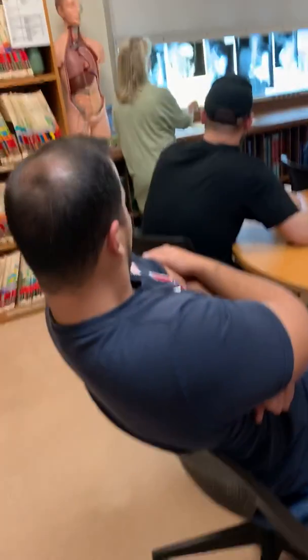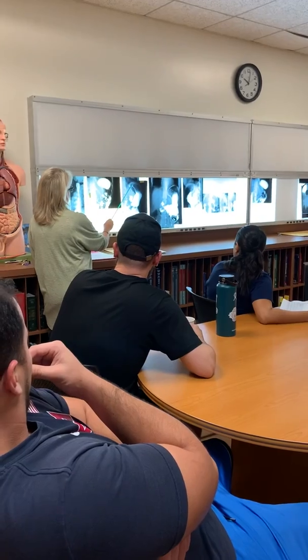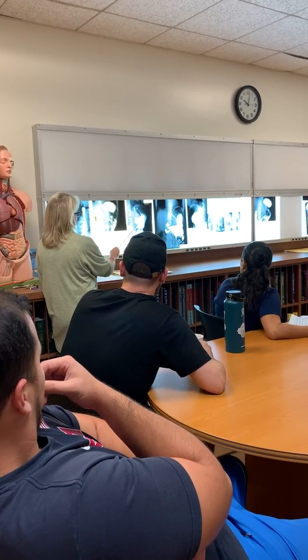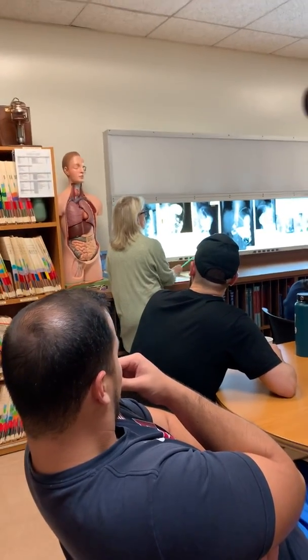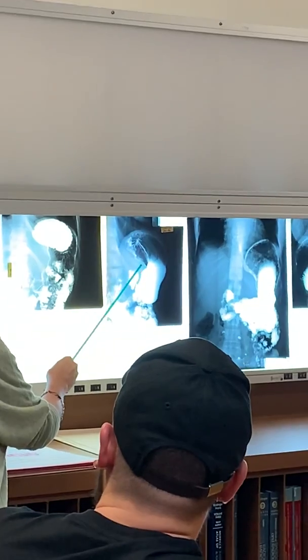White blob, I guess you could say. You don't see all that mucosa stuff. So if I would trace the liquid coming in here from the esophagus and going along here, what's this thing called? This is the greater curvature. Lesser curvature? No, this would be lesser curvature.